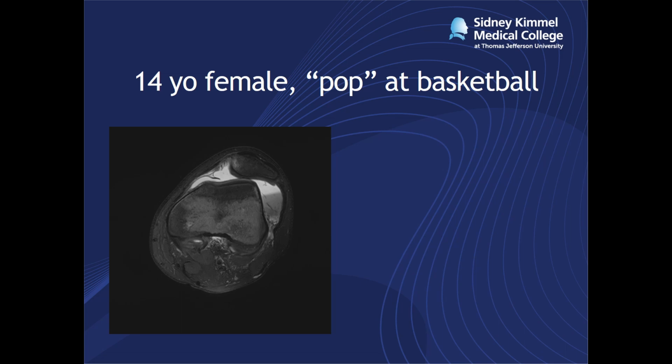In addition, this is showing the morphologic variations that predispose to instability. The trochlea is shallow here, and there's also what we would call the Wiberg type 3 morphology of the patella, where the medial patellar facet is short and vertically oriented, and the lateral patellar facet is elongated and horizontally oriented on these axial images. So you can get the sense that with the combination of these developmental variations, there's a pretty good chance that at some point this would slip out laterally, and that's what's happened here.